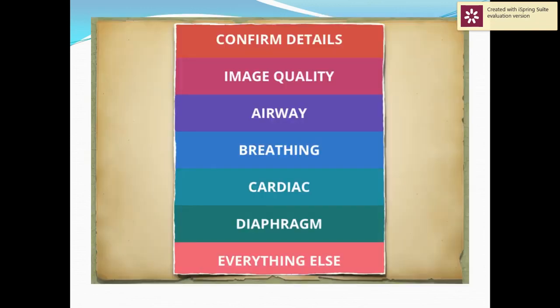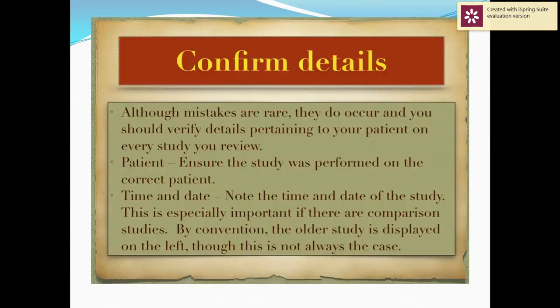So confirm the details of your patient data. The image quality also important. Look for the airway and inspiratory or expiratory film, cardiac shadow to look for the diaphragm, and another modality. طبعا we have to ensure that the patient performed for the correct patient. The time and the date is important. To compare also sometimes to compare several chest X-ray.